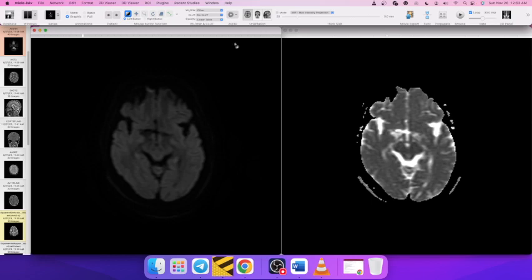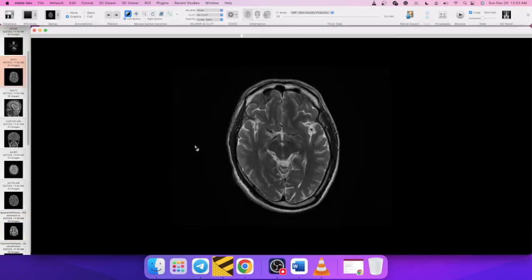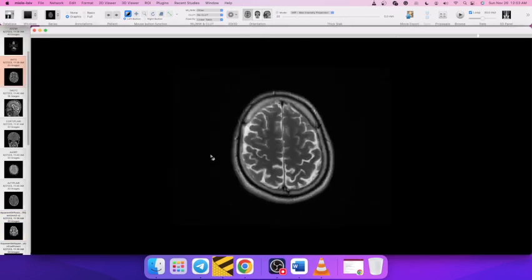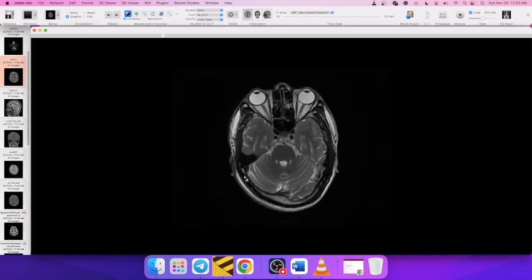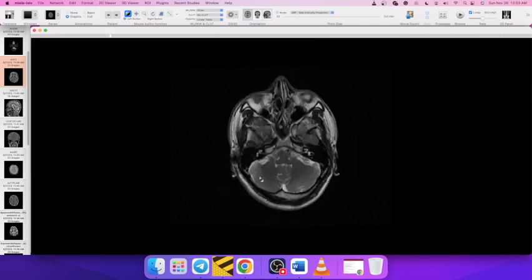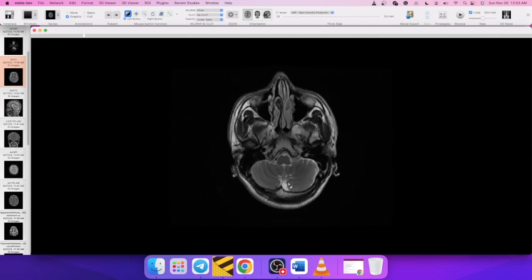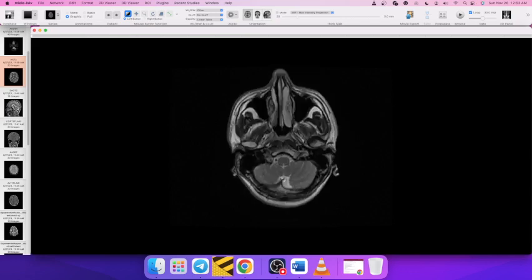Now coming to T2 weighted images. T2 weighted images also look good in this person. He's a 30-year-old coming with loss of sleep, no other symptoms. There is a small CSF space here which is prominent, which is abutting or mildly compressing the left cerebellum. I'll say abutting. And it has no communication with the fourth ventricle.